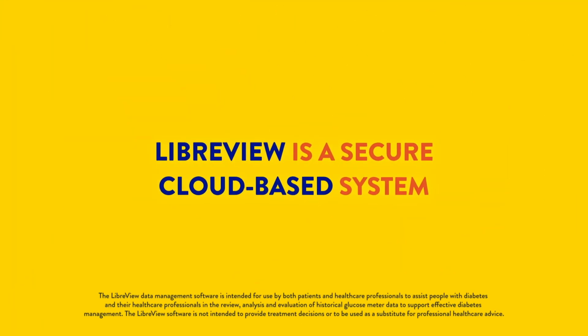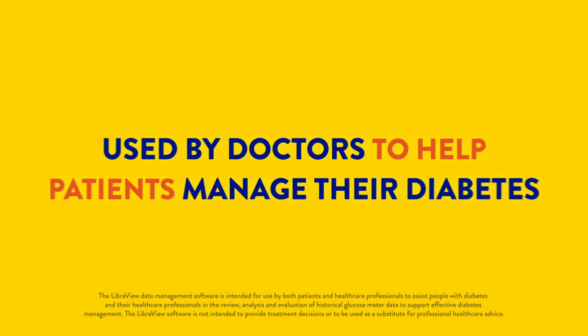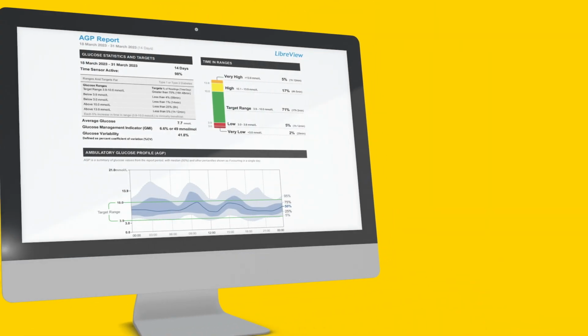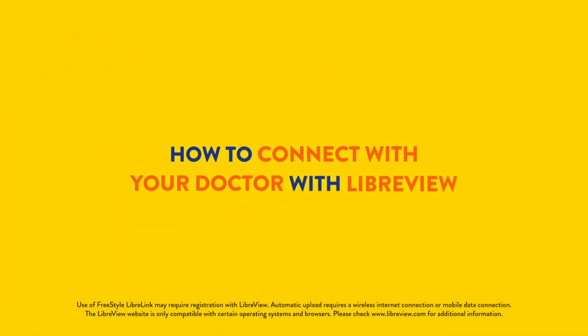LibreView is a secure, cloud-based system, primarily used by your doctor to manage patients on the FreeStyle Libre family of products. Once you're connected, they receive your glucose information in the form of clinical reports, which they can use to better understand how to help you manage your diabetes. Connecting with your doctor is easy.